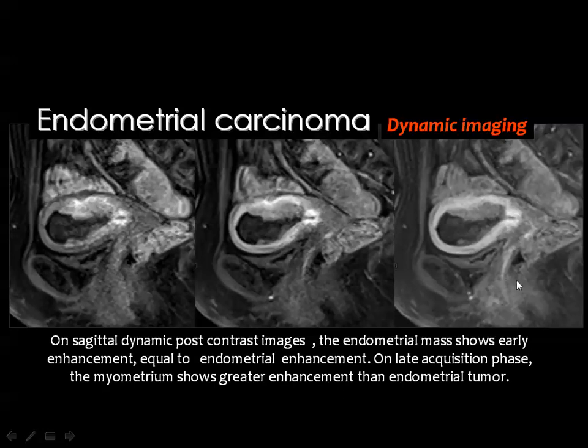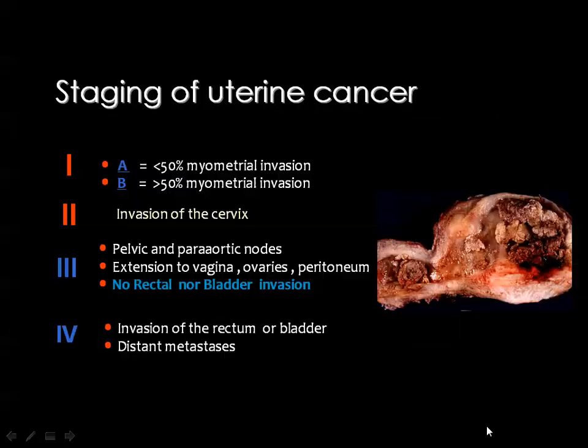the literature says that in the delayed images the myometrium will be adequately enhanced, while the original tumor will be washed out of the contrast. Then you get a better appreciation of the degree of invasion of the myometrium.